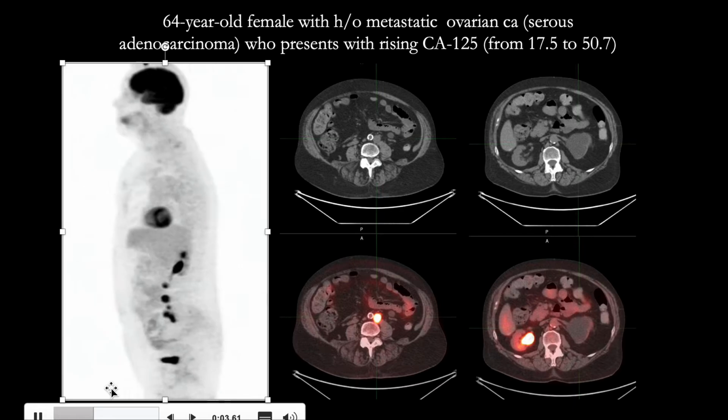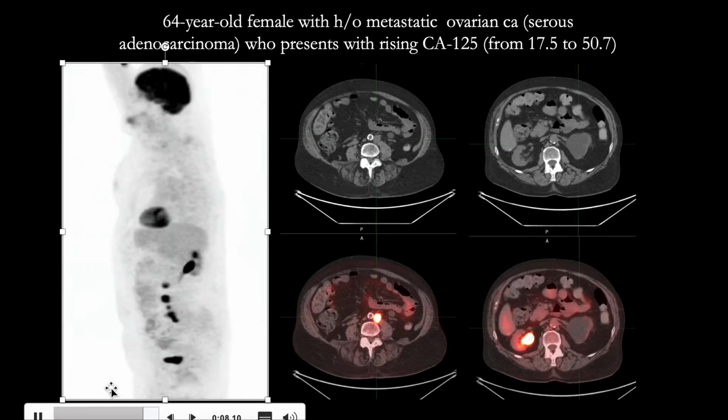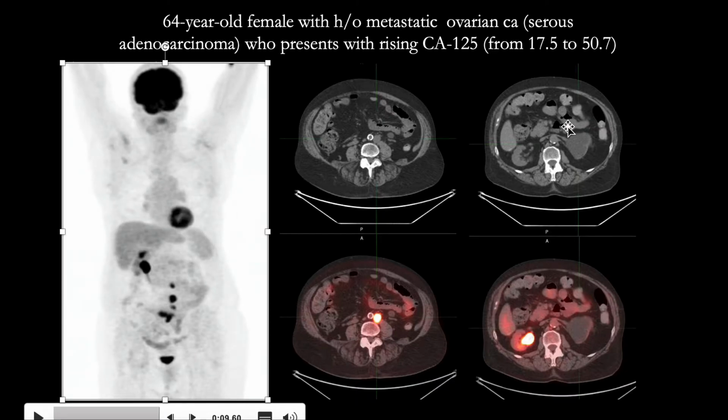Notice that there is no uptake and excretion of F18-FDG from the left kidney. And that is because the left kidney is hydronephrotic, that we see here, with very thin cortex, dilated collecting system, and then the ureter is obstructed by this retroperitoneal lymphadenopathy in the lower abdomen. So always pay attention to the kidneys and be aware of the manifestations of obstruction on the CT scan.